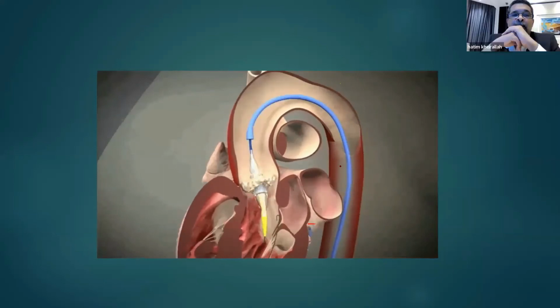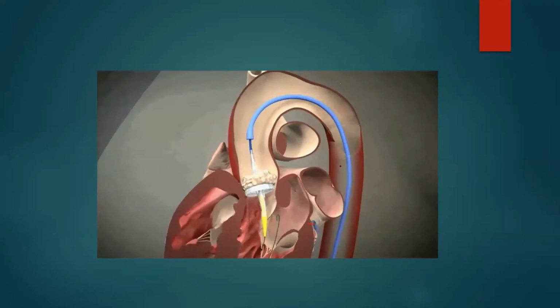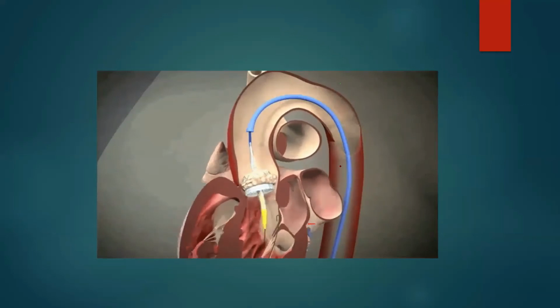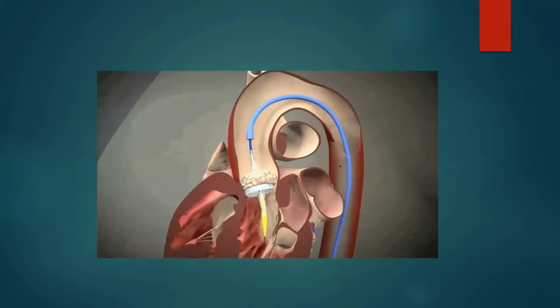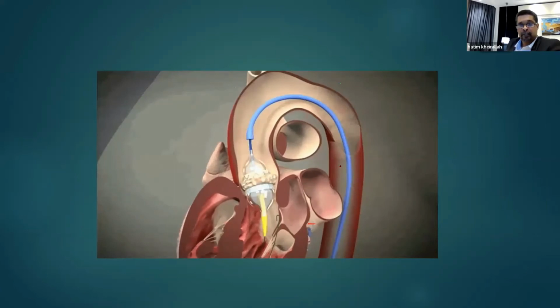What is this procedure? TAVI. Not TAVI. Aortic balloon pump. No. This is valve in valve. Yes.